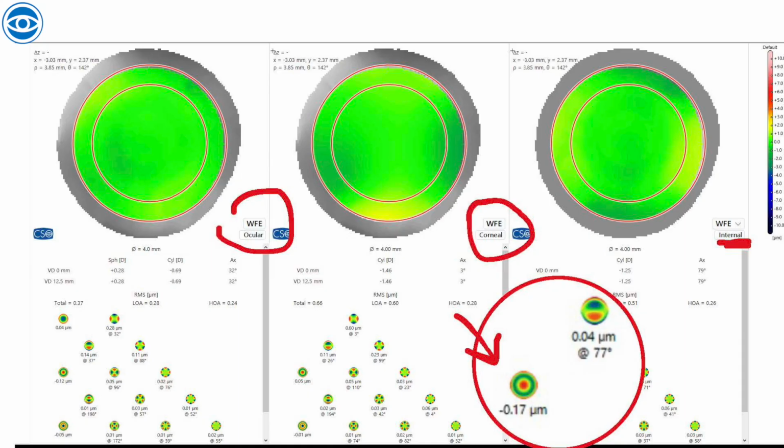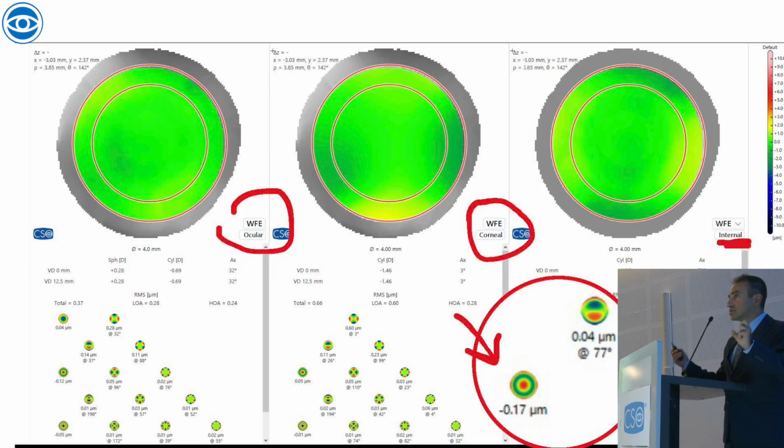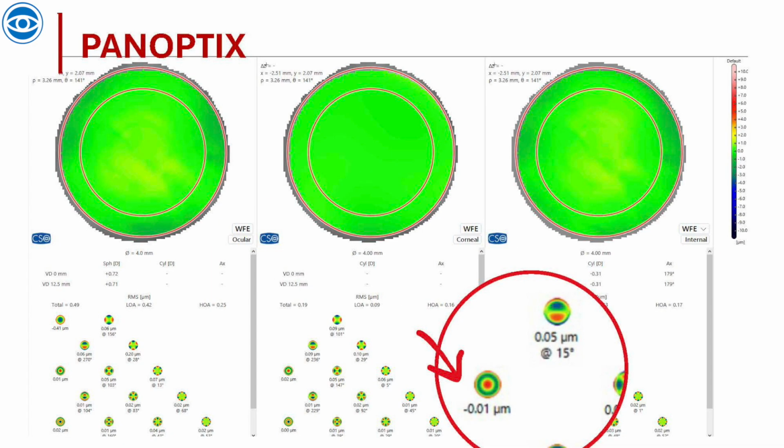You can get as much as a diopter and a half of coma internally to compensate, not just posterior curvature, and I'm talking intraocularly. And that's what separates us, by the way, from the eye trace, which cannot know that when it tells you internally, that's posterior and on. So if you have an IOL in a keratoconic patient, you won't be able to tell whether these aberrations are intraocular or quote unquote internally. So what you do is ocular wavefront, corneal wavefront, and that's internal, means intraocular.